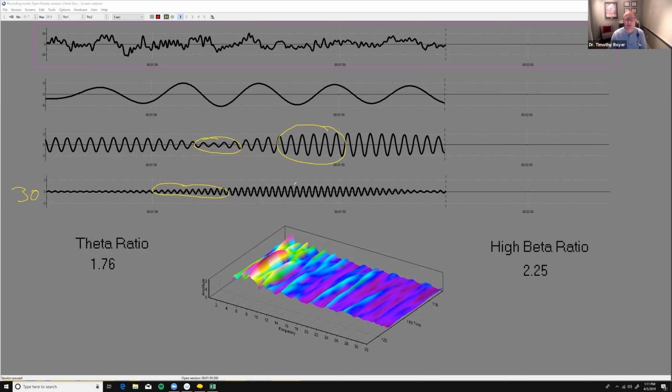And then all of a sudden it gets a little bit higher, meaning there's more going on in those higher frequencies. And down in this waveform, in this 3D image, it would have been when we saw one of these peaks. When you're looking at the 3D image, those peaks are when one of these frequencies starts to exhibit more power in it and the amplitude shoots up.